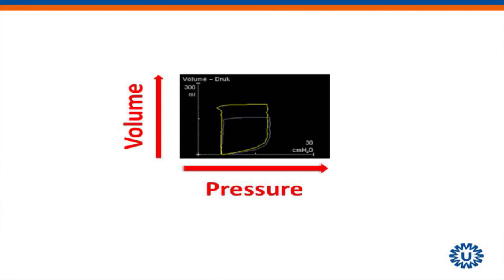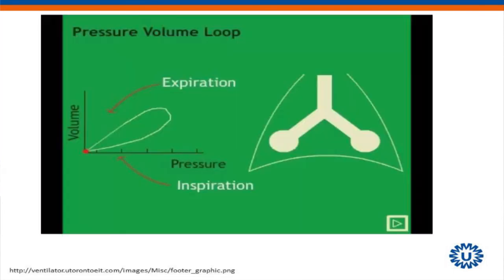How does the loop go? Let's hope the movie is working. What you see is inspiration, expiration. Inspiration, expiration. Inspiration, expiration.